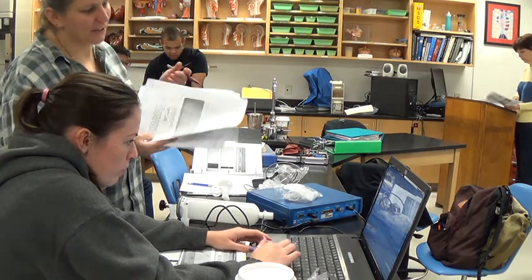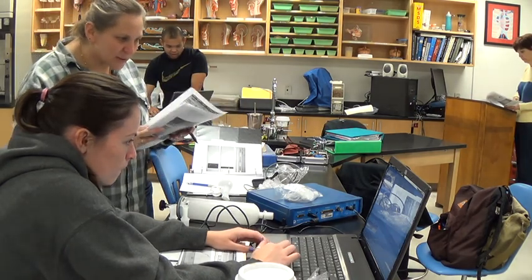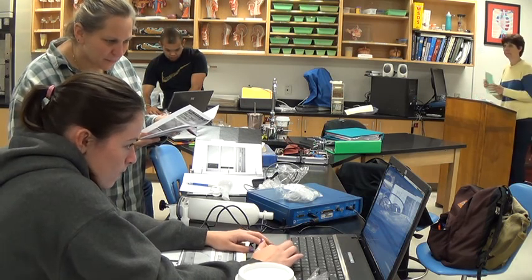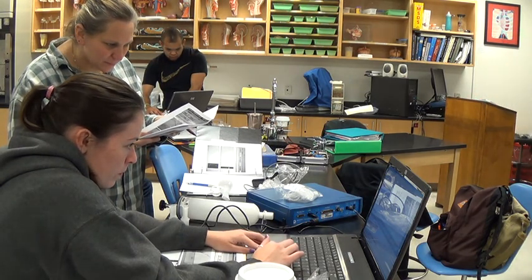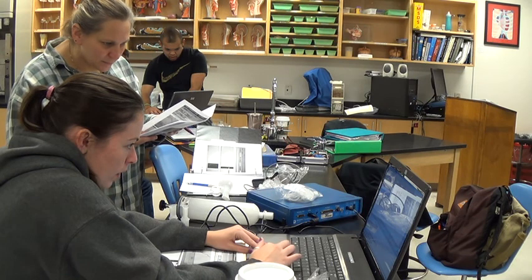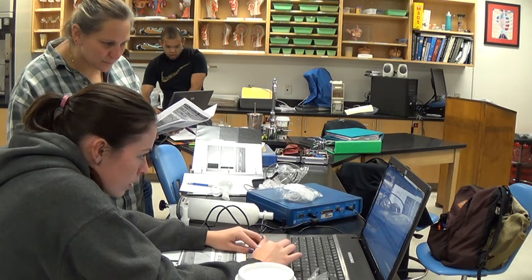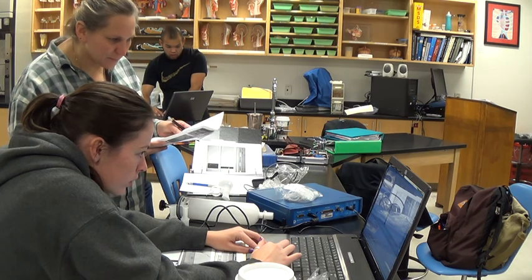Oh, analyze. So there it goes. How much would there be? The top of there? What did you guys get if you divided it? 26. So 26%. I'm close, I said 25.